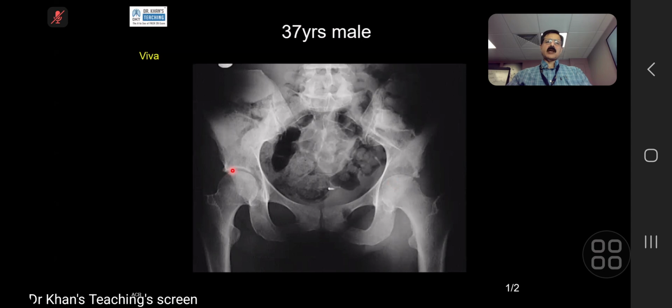Look at this acetabulum. It is crisp and sharp. Look at this articular surface. Here, that is gone. And if you look carefully, there is this bony destruction. There is actually a lytic lesion on the acetabular component. So this is acute osteomyelitis, septic arthritis, should I say.